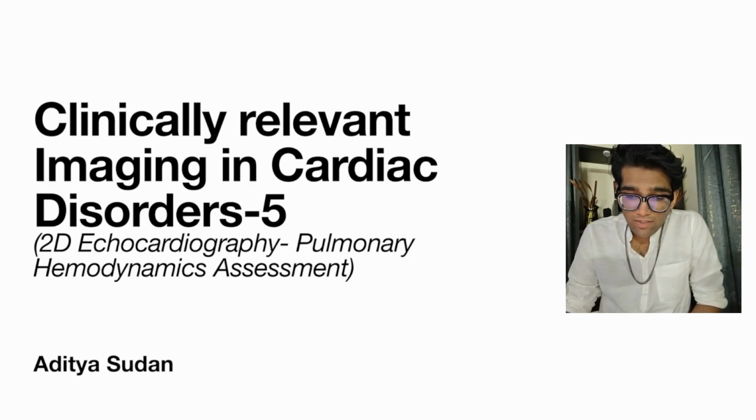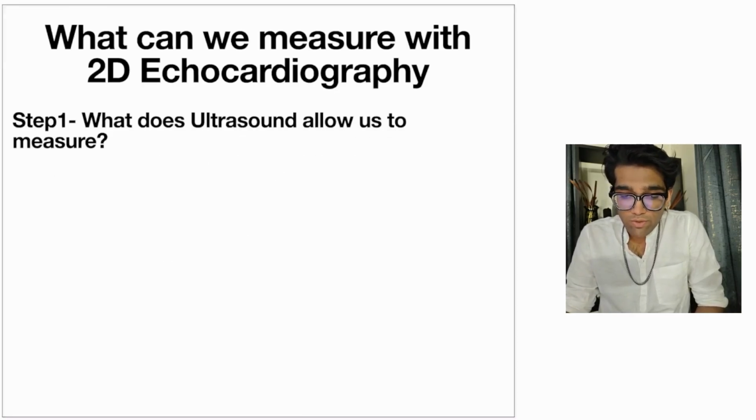Welcome back. Today we'll be discussing our final topic in the 2D echocardiographic assessment of cardiac disorders, under the broad heading of the approach to chronic shortness of breath. This will be a discussion on the assessment of pulmonary hemodynamics using 2D echocardiography.